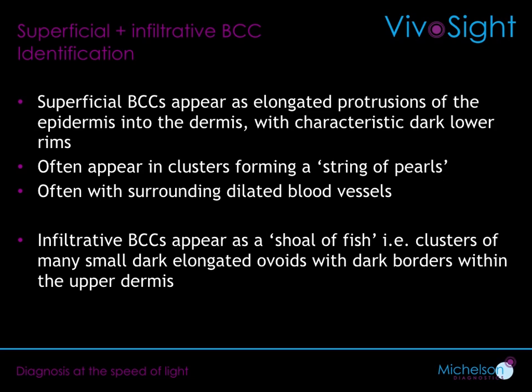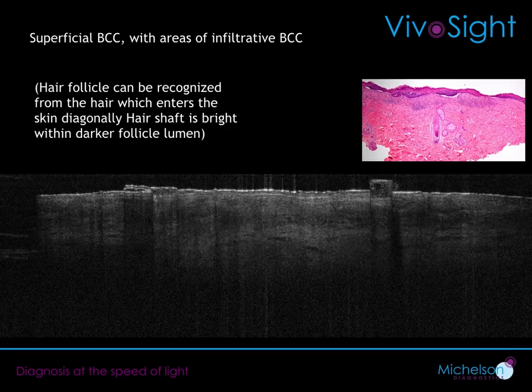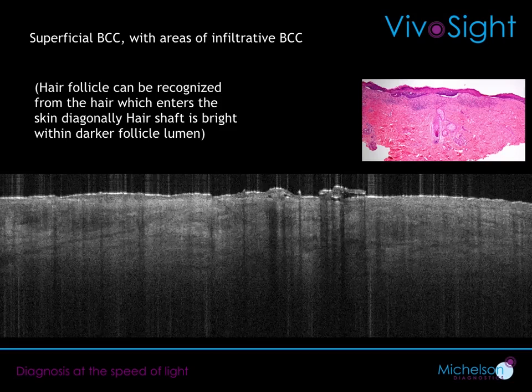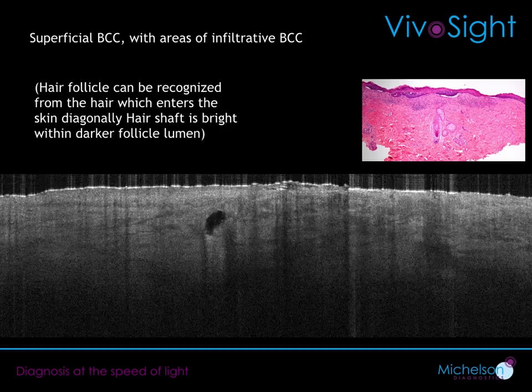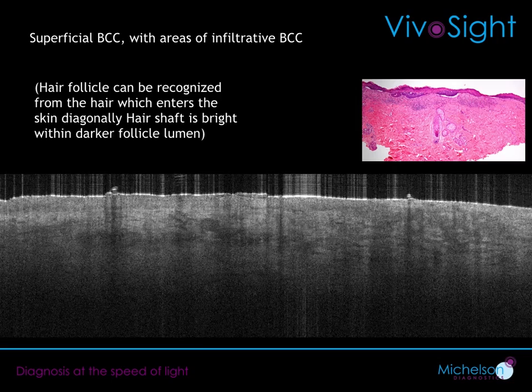The way it's going to work is that for any particular condition, the first slide will have some text detailing the characteristics of what to look for with OCT. The second slide will then put that into context by showing these features on an actual real-life OCT image, along with the histology and what can be seen with the naked eye. The third and final slide will then show a looping, real-time, fly-through video of the OCT scan, which mimics a clinician scrolling through the scan.